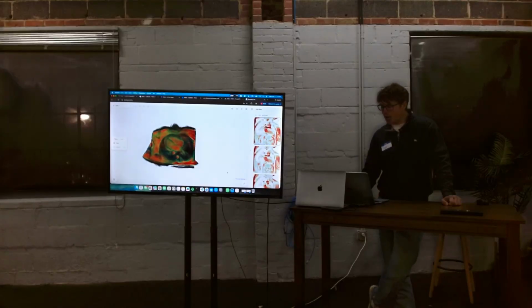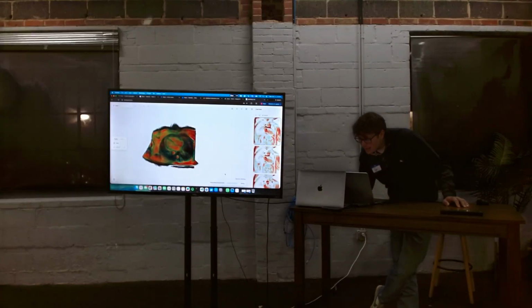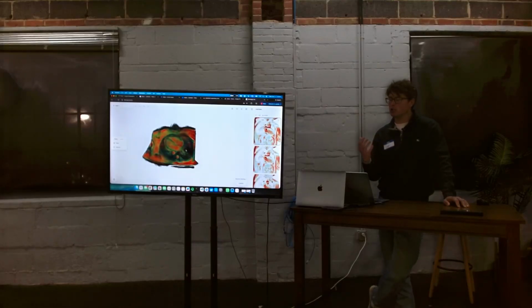And so I set up an API on Hugging Face for SAM3, and I'll enter the key, connect it. The nice thing about SAM3 is it allows for a lot of different types of prompts. It doesn't just take an image in and give segmentation out, you actually have to guide it. You can either show it a shape or type what it's supposed to draw.